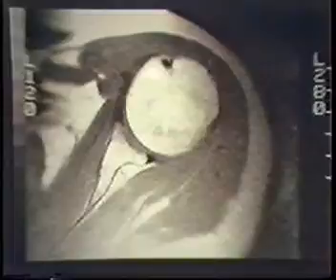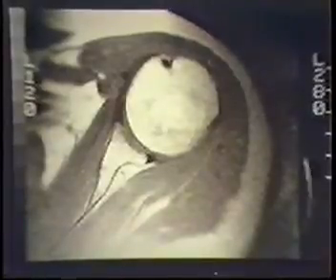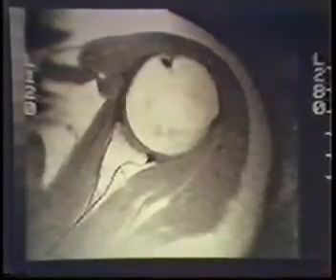The other thing to look for is the long head of the biceps tendon. You can see it very, very well by MR in this plane. One of the reasons I get the T2 weighted image is to look for fluid around the long head of the biceps tendon. You can also see a lot of other anatomy around the shoulder in the axial plane, but these are the main things I'm looking for: the glenoid labrum and the long head of the biceps in the axial plane.